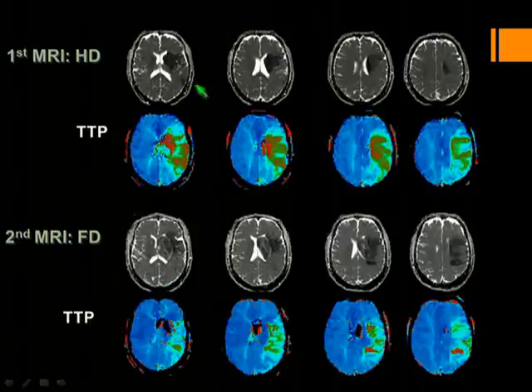I'm showing you this slide because this is the best I could do to show a side-by-side half-dose, full-dose perfusion in an acute stroke patient. For ethical reasons and IRB issues, we can't really duplicate this in a real patient. The first scan was done using our 6-minute stroke protocol. These are half-dose perfusion images. For the second scan, we didn't do contrast-enhanced MRA, and therefore these perfusion images were acquired with full-dose perfusion.